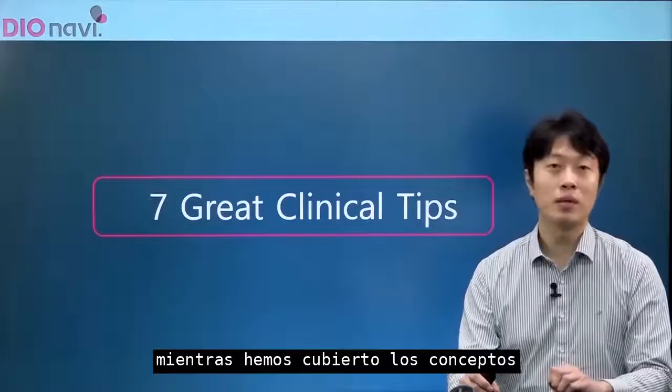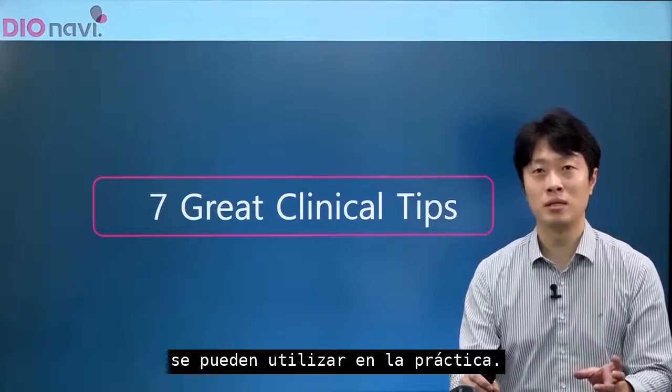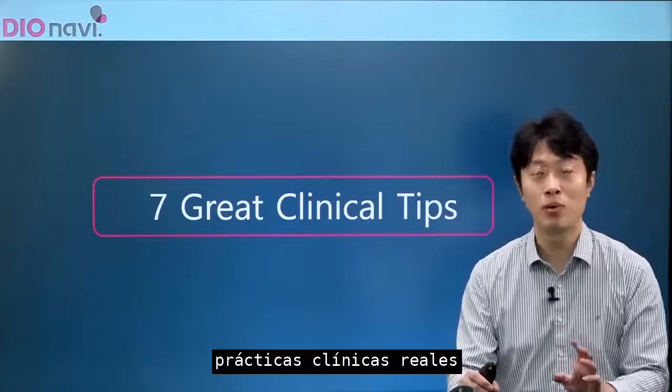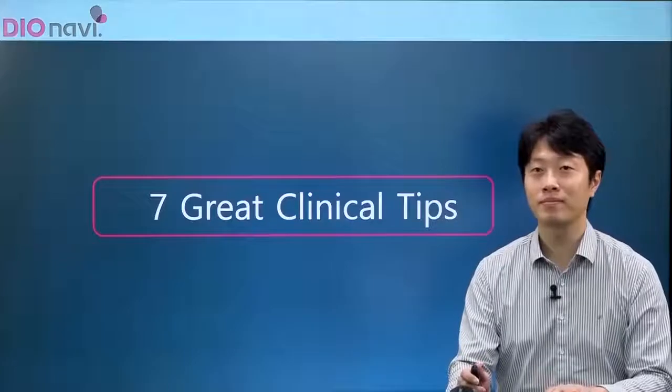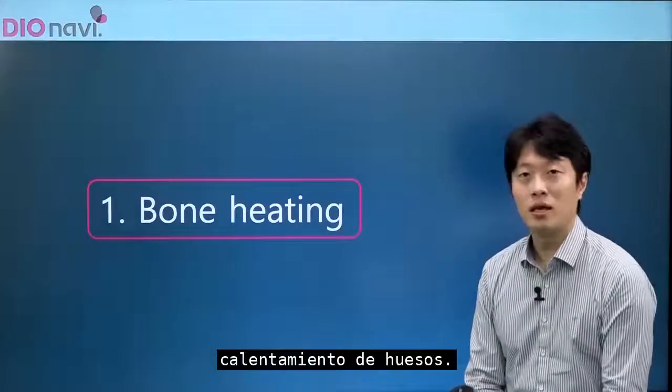While we have covered the basics thus far, now let's consider a few clinical tips that can be used in actual clinical practices. The first is about bone heating.